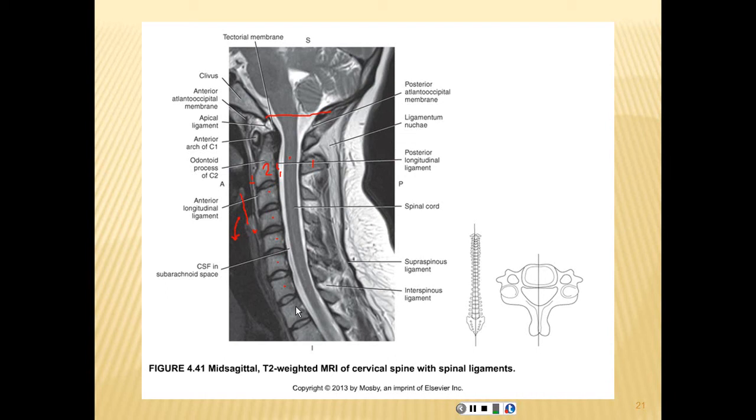Another thing that you want to think about when you do the cervical spine is that the nerve that's exiting the cervical spine, unlike the T and L spine where the nerve is under the corresponding vertebra, in the C-spine the nerve is over. The reason is because there are 7 cervical vertebrae. However, there are 8 cervical nerves.